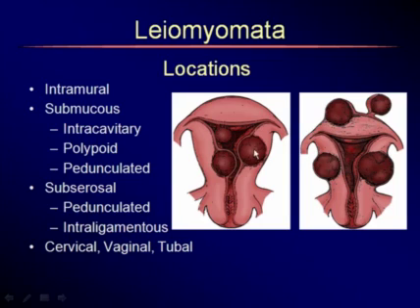So we would like to describe it. In this case, we should say that this is a fibroid which is over 50% submucosal, and the rest of it is intramural. And then if you tell the clinician there's a centimeter or 1.3 centimeter myometrial covering, then they know precisely they can go in hysteroscopically and take this out.